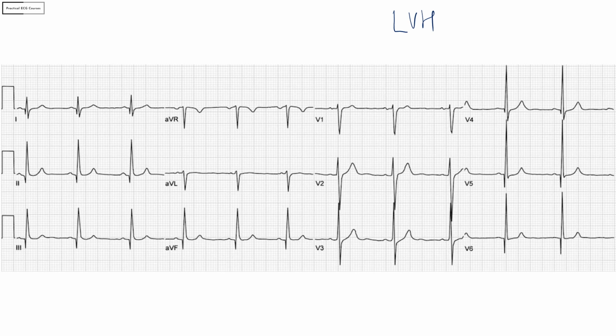The first is that we still do not know what is causing the LVH. Is it hypertension or aortic stenosis or something else? And more importantly, how do you explain the deep Q waves in V5 and V6? The reason why this is important is because normally LVH is associated with small or absent Q waves. It is a lesser known facet of LVH, but as LVH worsens, the Q wave keeps becoming smaller, and then disappears. But in this ECG, you can see that the Q waves are disproportionately large compared to the LVH that you are expecting to see in this patient.